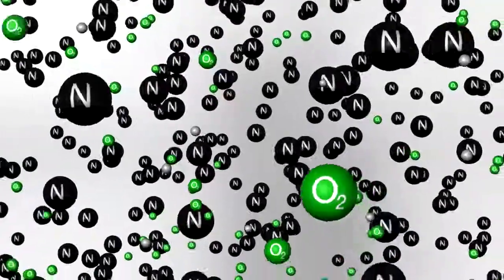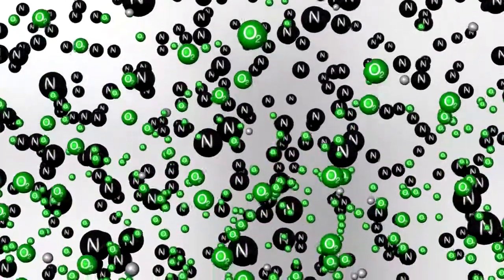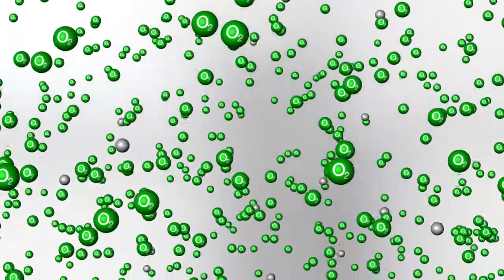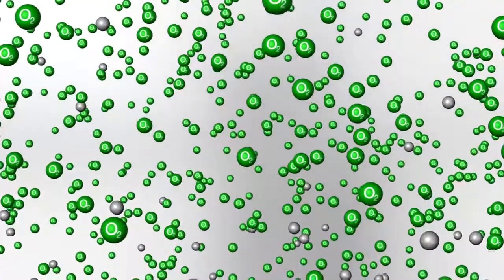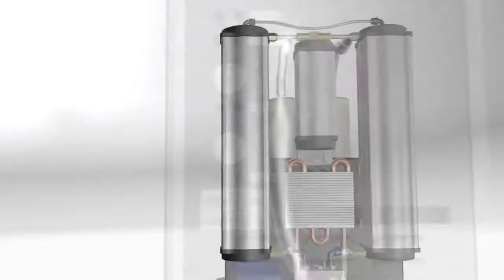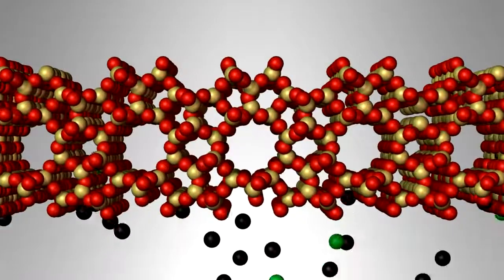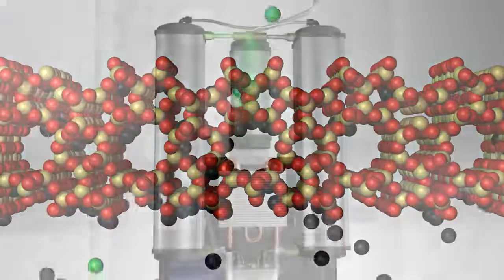Ambient air is made up of 78% nitrogen, 21% oxygen, and 1% other gases. The oxygen concentrator in the UAM removes nitrogen from the room air, creating a mixture that is up to 95% oxygen, depending on environmental conditions. Air is drawn into the UAM and is purified by two different filters. The compressed air passes into a canister filled with a powdered material called zeolite. Nitrogen sticks to the zeolite, while oxygen and other gases flow through it to a reservoir tank.